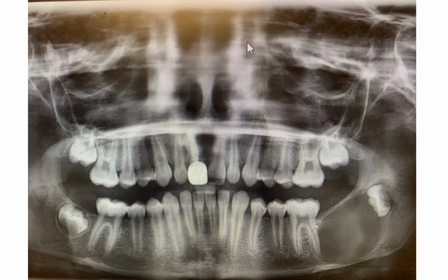Over the 2 years it has enlarged quite a bit, such that the height of the alveolar process or mandible has increased. Just look at the other side. That's the normal side, and this is obviously the abnormal side. Not only has it increased quite a bit, there is a thinning of the inferior cortex of the mandible. On this radiograph, I think it's very hard to discern the position of the mandibular canal, and at least over on here, I don't see any evidence of root resorption or displacement.